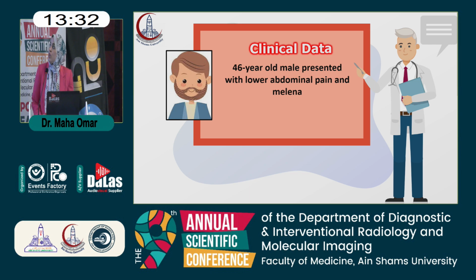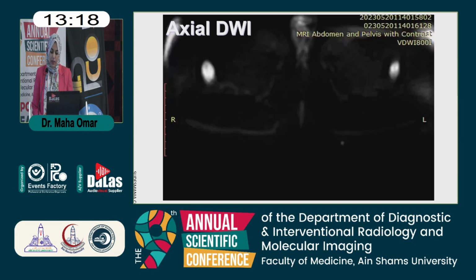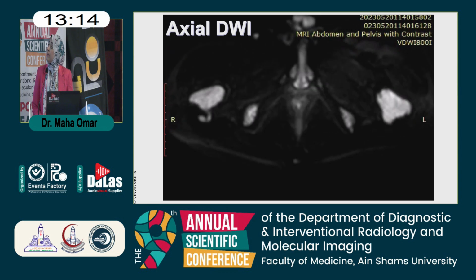He is a 46-year-old male patient presenting with lower abdominal pain and melena. The patient underwent MRI of the abdomen and pelvis with IV contrast. I'm going to present only the pelvic sequences because they have the findings. This is the axial diffusion weighted images.